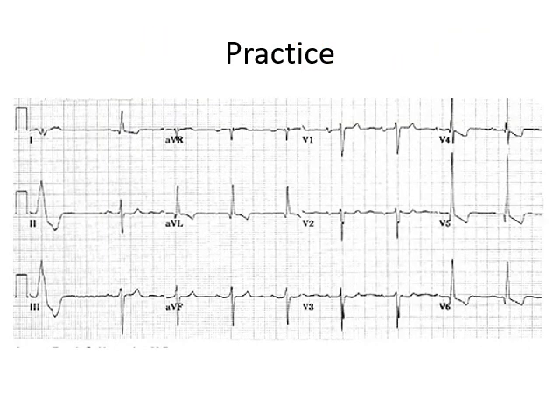Let's have a look at next ECG. I'll take a 1 second pause. Alright, so most of you I'm sure have identified it correctly that this is T wave inversion in lead V5 to V6 and probably in lead 2 and 3 and AVL as well.